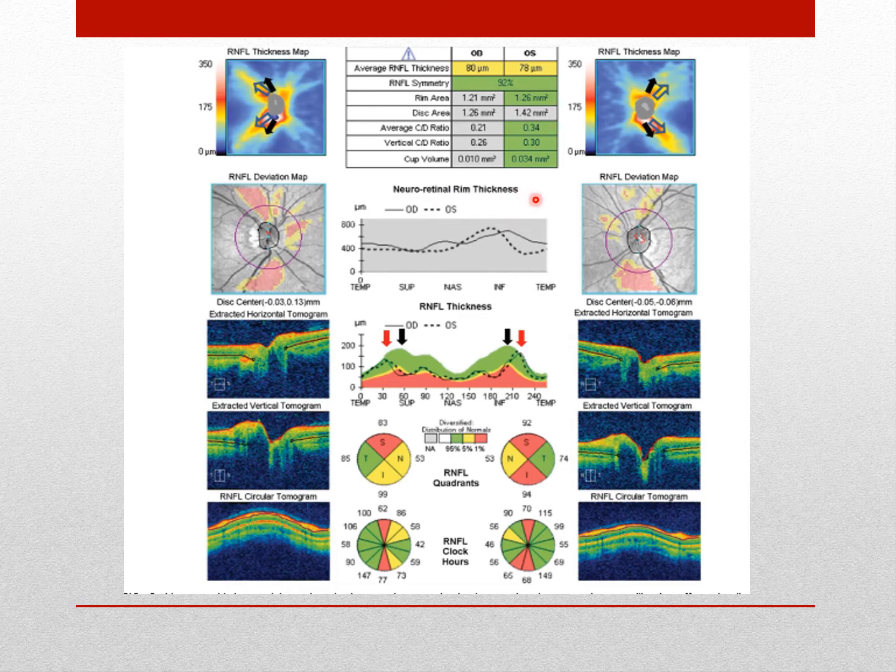Remember I said too, with increase of myopia and longer axial length, you're going to get induced magnification. Well, in this case it's induced minification. You can see here in the right eye, you have a small disc and the optic cup is small too, but this is a myopic fundus. Usually you don't see that with myopia, right? Because everything's being stretched out and thinned out, but here everything looks smaller, it's induced.